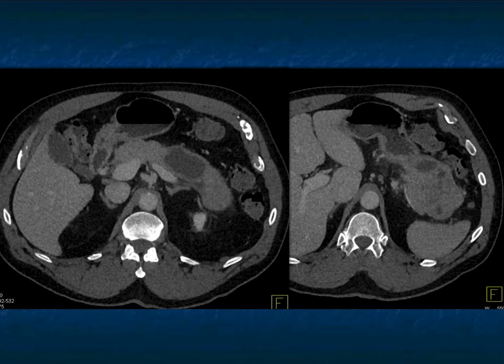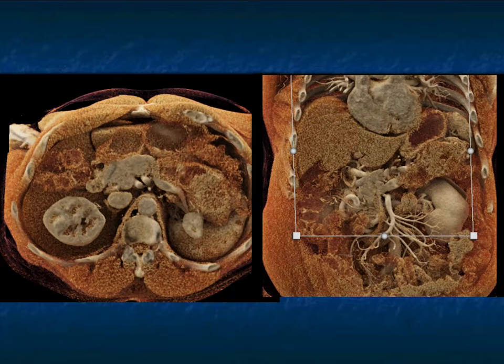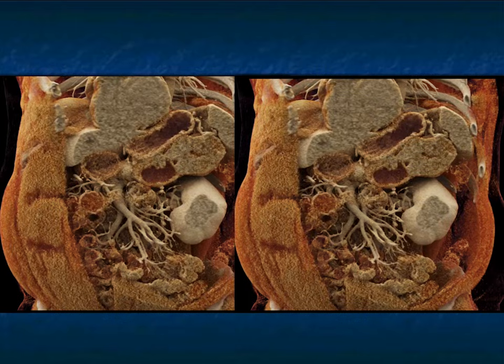So just to be clear, there are certain pancreatic tumors that are in the category, if we think about adenocarcinoma, that are not necessarily on path adenocarcinomas, but again, it really does look like adenocarcinoma, but this was an acinar cell tumor, really nicely shown as well on the cinematic rendering. So if you have a large mass, solid and cystic, think about adenocarcinoma. Obviously, you're not thinking about a serous cystadenoma or a mucinous tumor unless it was a mucinous tumor that then had tumor invasion and had adenocarcinoma. But again, think about an acinar cell tumor.